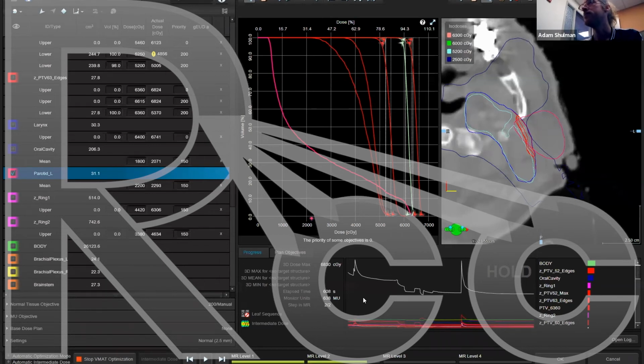If you remember from the Acuros Monte Carlo talk, some centers will even override their entire PTV to water, and the difference in dose to the GTV is only about 2 or 3%. So it's not a big issue. We'll just override to minus 700. That's going to have almost zero effect on the actual dose to the GTV and a moving ITV on the lung tumor. So that's the only scenario that I see where tissue density could have an effect.